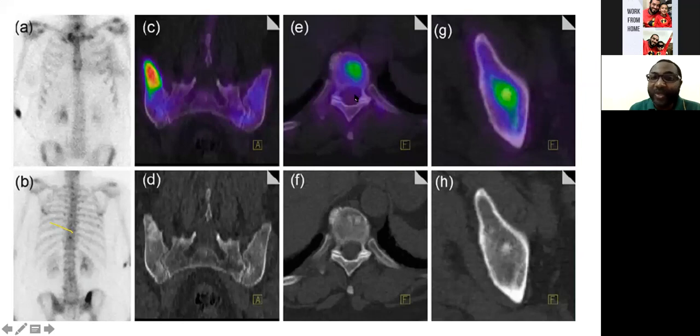And you know that metastases have preferential areas of affectation. Usually metastasis affects the pedicle, but degenerative changes usually go to the anterior body, or to the facet joint. So the idea of combining or simultaneously acquiring the nuclear medicine SPECT and the CT component is for proper anatomical localization, like you can see from this. So again, this is a static view.